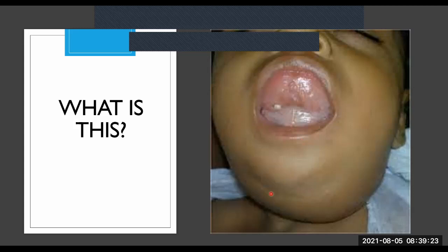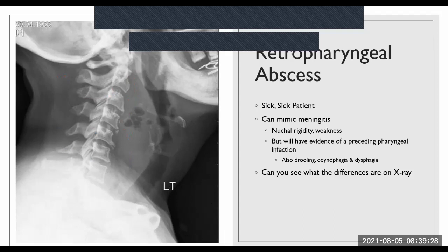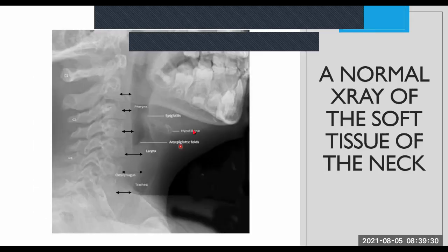The main problem is the swelling. All right, so let's go back just one more. I just want you guys to have a look at this. So I just want to get back to the normal X-ray. Basically, this is where the swelling is starting, in the bottom over there. There's not much space for everything.